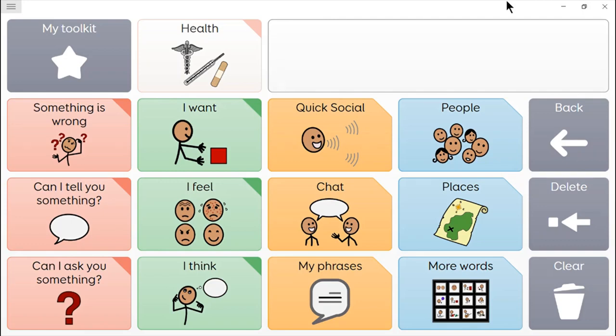My microphone isn't very good, but this is just a first shot at trying to improve that photo stories feature to be a little bit more similar to Communicator 5 and a little bit easier to use to tell a story. So I also set up scanning on my computer. It's not the exact settings that you have, but it should be good enough to test out what it's like to scan to use these pages.